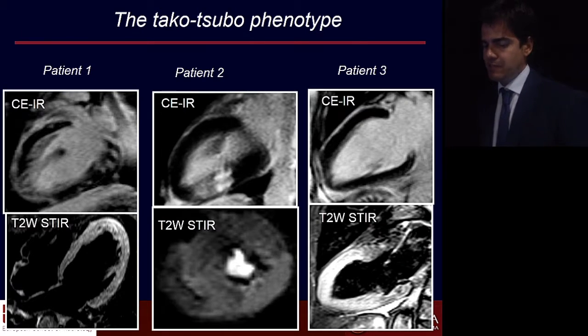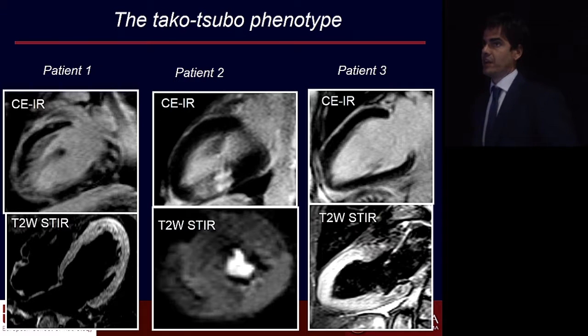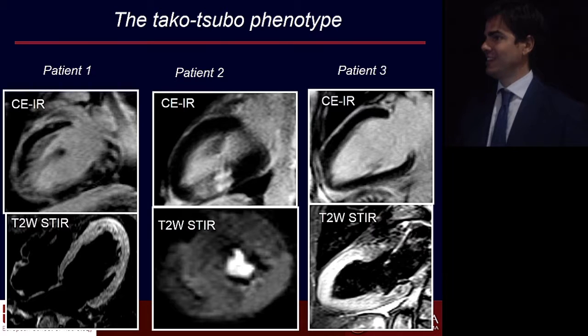One of those cases, case number 2, is not the best quality, but it's a real life case. And I would like you to give me the 3 different diagnoses here. Even if you're not experienced with cardiac MR, I think with the elements we had during my lecture, you could give a diagnosis. Who wants to comment on patient number 1? Again, it's a friendly discussion, so don't be shy, even in Spanish or whatever.